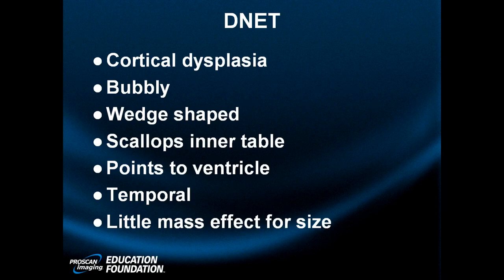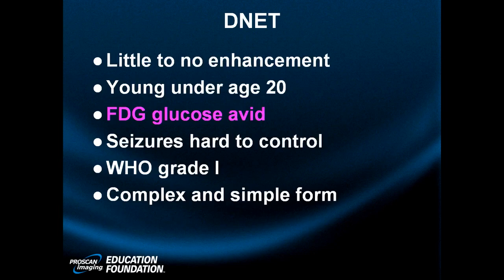They scallop the inner table when they're peripheral. They point to the ventricle. This one does. They're temporal. This one is. They have little mass effect for size. This one does. They have little to no enhancement, usually under age 20. Ganglioglioma, older.